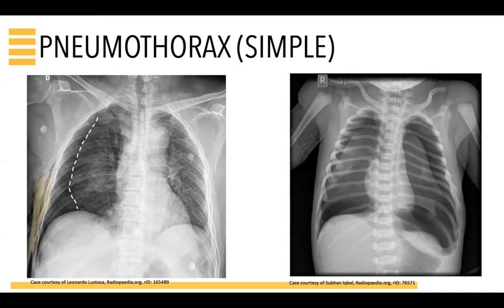The chest X-ray on the right is of a 10-day-old neonate with bilateral pneumothoraces. Notice the pleural borders on the right and left, the deep sulcus sign bilaterally, and the lack of mediastinal shift. It is important to note that this chest X-ray has the features of simple pneumothoraces, but due to the bilaterality of the insult, absence of mediastinal shift does not rule out tension pneumothorax.